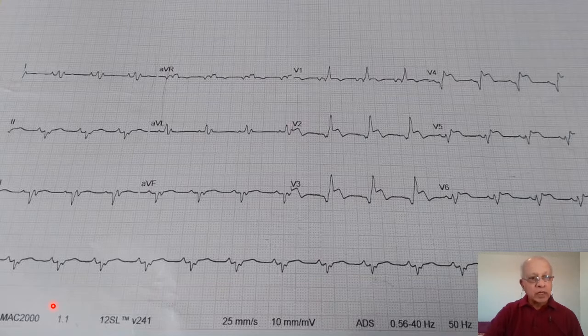Secondly, can you tell from this ECG whether this patient had any chronic symptoms previous to his symptoms of today? If you say so, let me know why you said that. And third would be, what would be your preferred line of management in this patient? So friends, I will give you about 2 minutes and you can start answering the question.